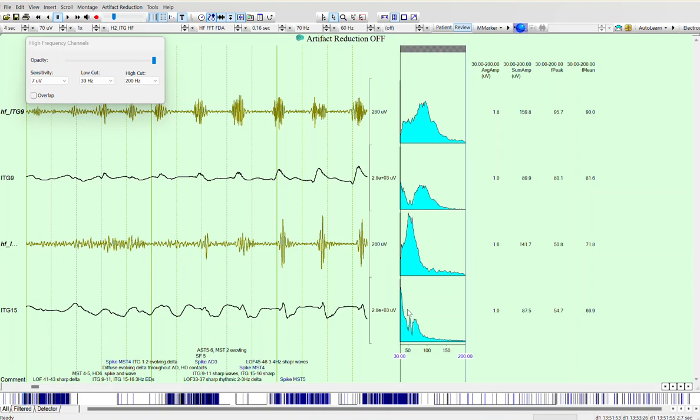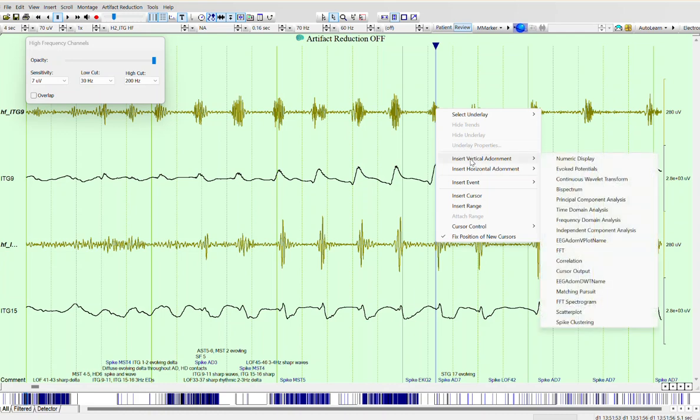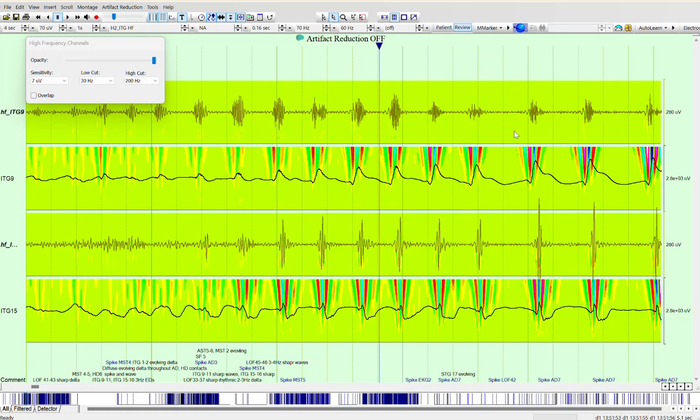That is a rather quick way of going through it, but I wanted to accompany this with a document that I put together showing the steps. This isn't the only analysis you can do. Of course, you've got lots of other analysis tools that you can apply to this, and or even under it. It's interesting to see, for instance, what a continuous wavelet transform looks like when applied to the EEG. Of course, there you have accuracy in time and frequency doing wavelet transforms. So just an interesting visual to wrap up with.